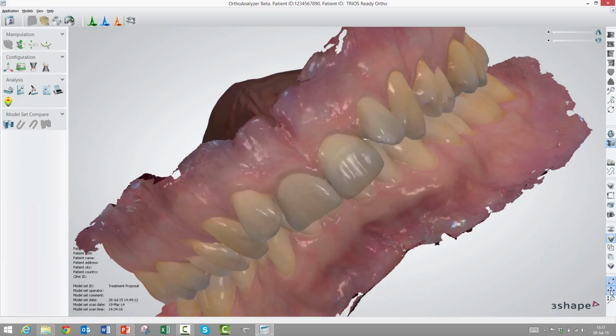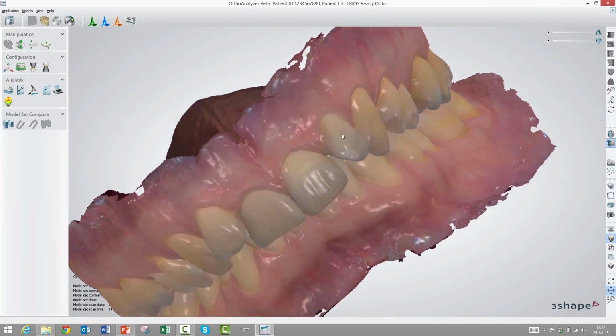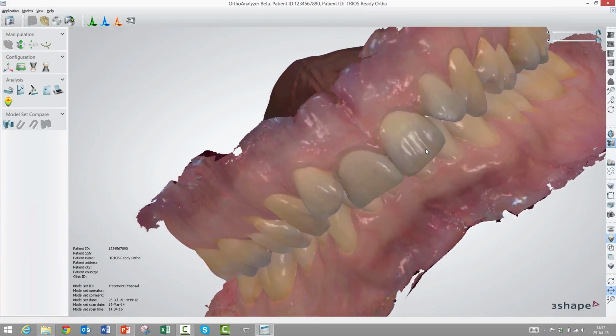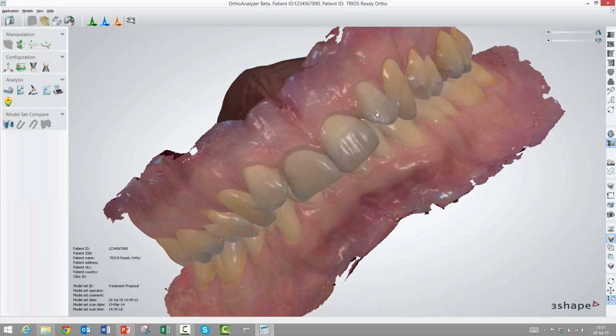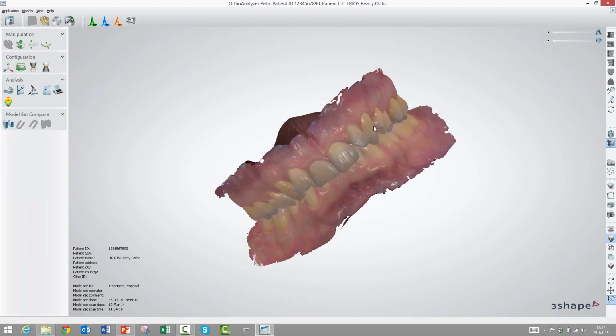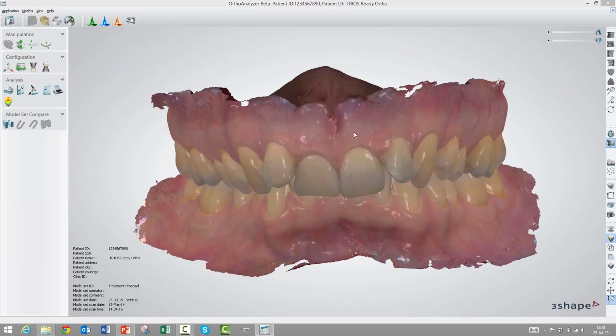If I choose pan view and now go back here and move my right side again, it will now work exactly like the middle button is working here. And if I choose the last button here, zoom view, you probably guessed it, and I operate the right side of the mouse, it will work exactly like a scroll wheel. So if you do not have a mouse with a middle button or a scroll wheel, you can imitate that by working with the tools down here. But again, we do recommend that you find a mouse with all these different buttons on. Okay, let's zoom in here.